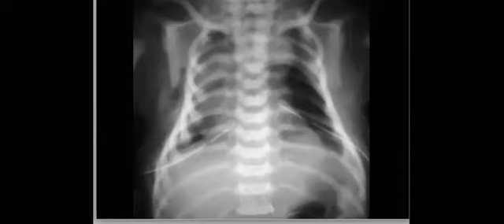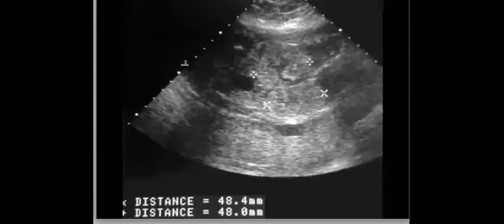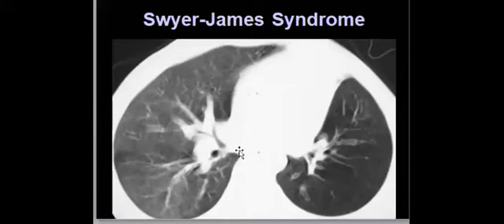And sometimes you know that pulmonary hypoplasia has some association with renal agenesis and autosomal recessive polycystic kidneys. Okay. Anyway, it can be Macleod like this one, Swyer-James, hyperlucent. Fauzi, okay. It can also be something like this appearance, or how do we describe it?